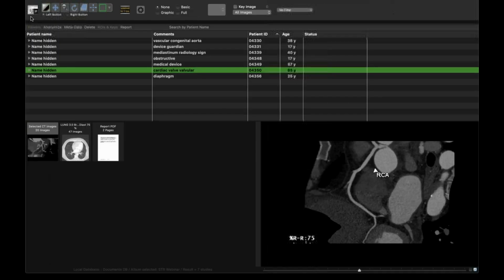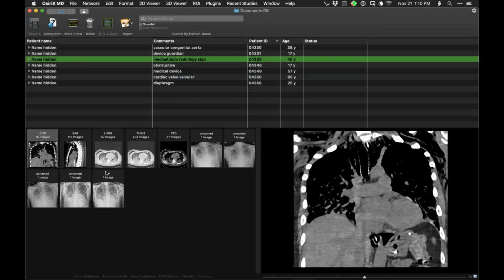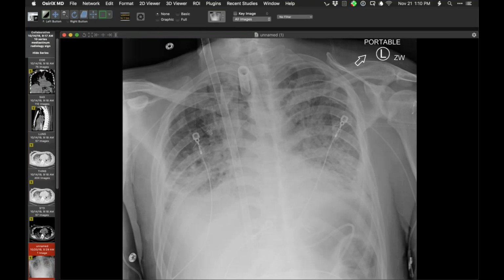Okay, good. Let me show you this one. This one is sort of, in a way, back to basics, but when you read a lot of bedside radiographs in really sick patients, sometimes, as in this case, the findings that are of some relevance were not really identified. So the clinical context, of course, is a very ill patient.